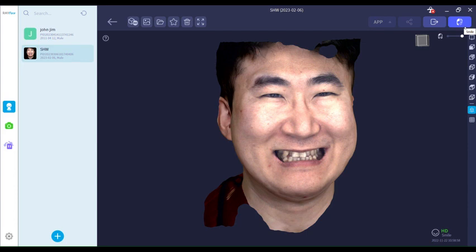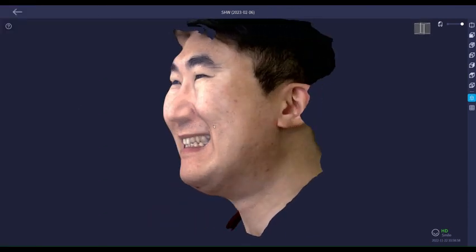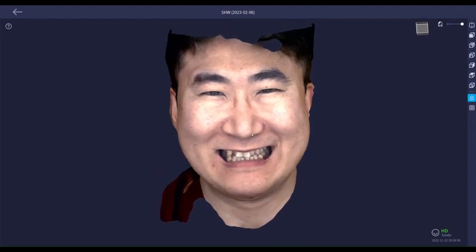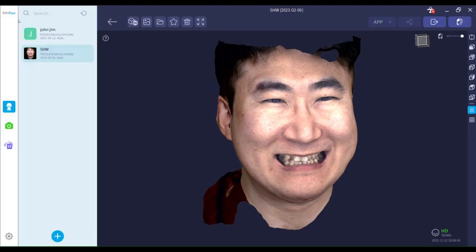You can also begin your smile design by clicking on this icon, but we will complete that at a later date. You can expand the screen by maximizing with the maximization tool. This is great for demonstrating to the patient, so there are less icons to make the demonstration less busy. You can delete the icon.